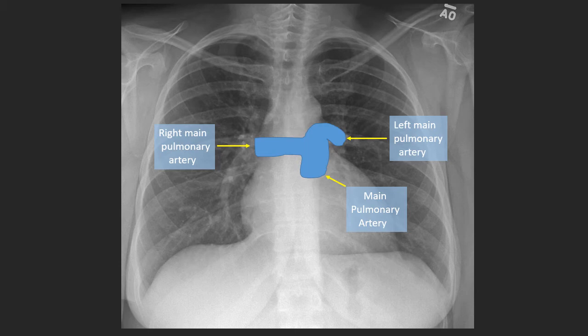Well, the structure that goes over the right main stem bronchus is your azygous vein. The way I remember that is that veins are on the right and arteries are on the left. So on the left side, the main pulmonary artery goes over the left main stem bronchus. On the right side, what goes over that? It's going to be a vein, and it's your azygous vein. So the left main stem bronchus is hyparterial. The right main stem bronchus is eparterial. Important anatomy for you to remember and how this corresponds to what we see on the lateral radiograph.